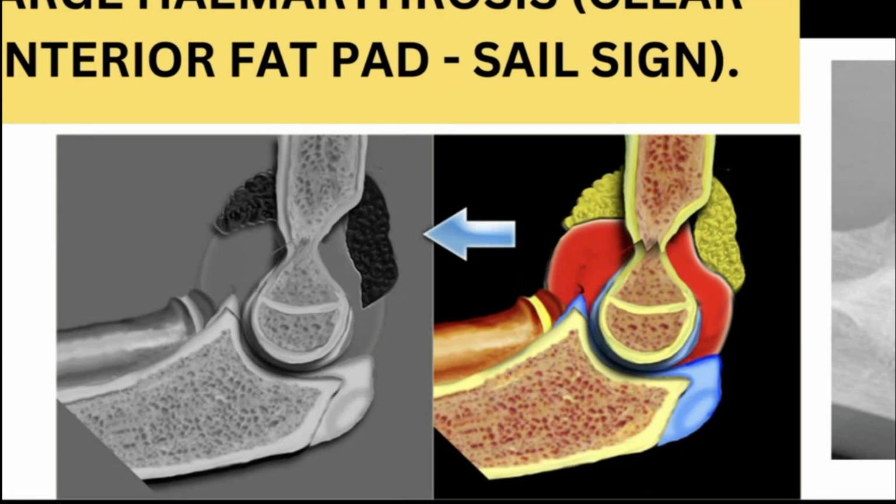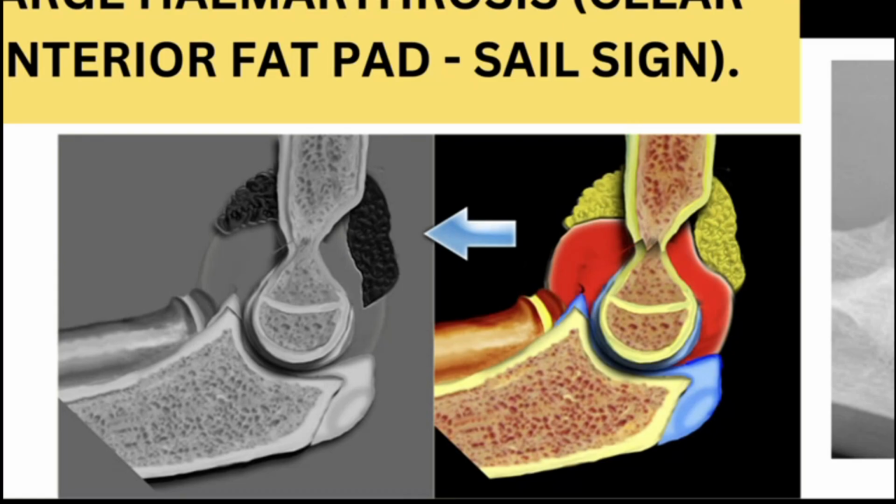And when it happens in the elbow, the joint capsule, as you can see there, distends proximally, and those fat pads, which are normally just hugging and sitting on top of the joint capsule, are therefore elevated. Okay, and because you have fluid in that joint, you can see the difference between the fluid and the fat, and that's how you get that silhouette formed.